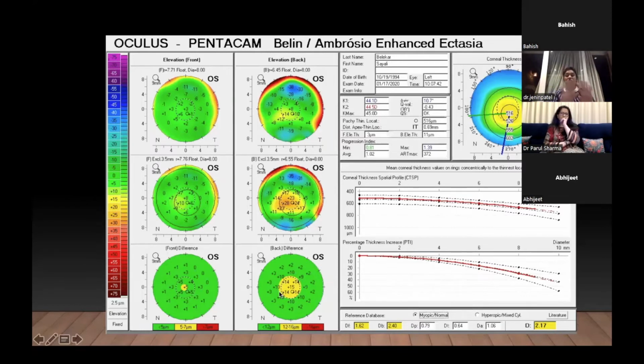Now, what this has also done, it has made it very easy by telling us that if you see anything in the yellow, it is suspicious. If anything in the red, it is something that you have to be cautious about. Anything in the green is normal and you're good to go. You also have deviations which are seen over here.